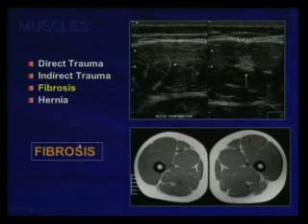With ultrasound, we can also see fibrosis. Look at this comparative MRI. This is the indirect tendon of the rectus femoris, which is normal, and in this case it is thick and black, right? It's thicker than the other one, and this is because of fibrosis. But this is very difficult to diagnose if you don't have the contralateral one.